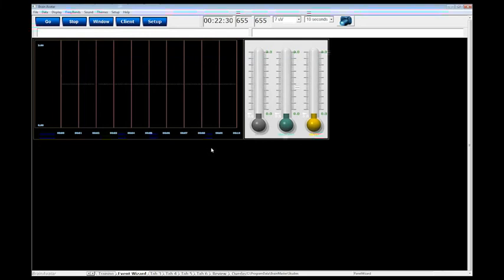Well, actually, I was wondering how you get into the screen you've got on right now with tabs 1 to 6, as opposed to the tabs Acquire Waveforms and Training Waves. How did you get back and forth from that? When you first started, you had Acquire Waveforms where tab 1 is, and tab 2 was Training Waves. Okay, I know what you're asking. There's no real way. Each setting file that you build in each patient's folder is its own set of information. The first one was a special protocol I set up just to get going today, so I could show you some of the basics right off the bat. This was another one that I wanted to set up on a protocol that was already imported. And on this one right here, I started doing it on its own. So right off the bat, most of the things are going to say tab 1, tab 2, tab 3, tab 4, etc. You control what they say.